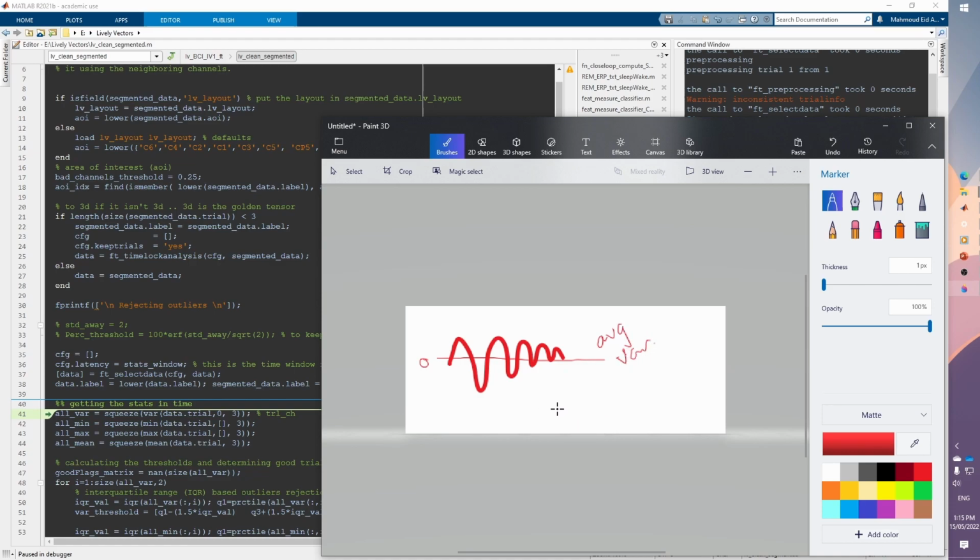If we imagine that we have another data like that, and the data is going like crazy, really increasing and decreasing by a huge amount with huge amplitude, this will have a very high distance from the mean. So basically, if this is the mean of our data, then the distance from the mean of each sample is high.